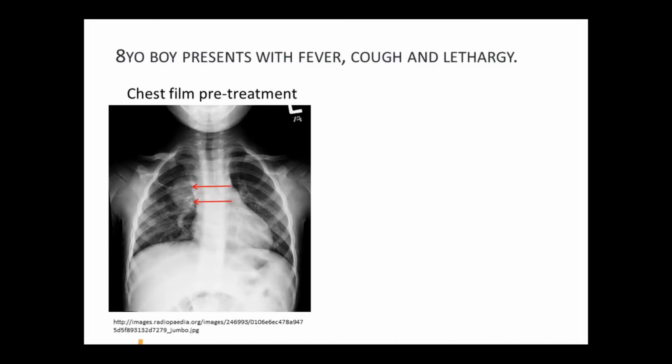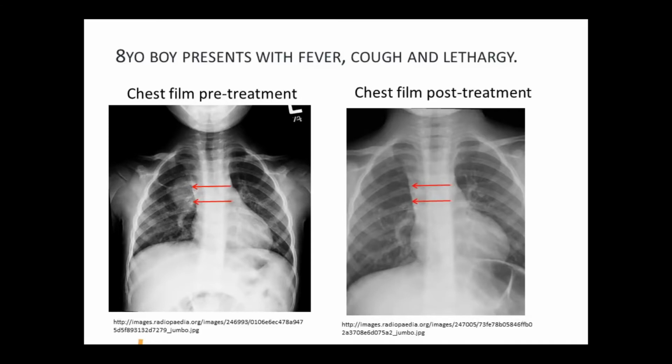Pneumococcal infection is the culprit in the majority of round pneumonia cases. The film on the right-hand side was taken after 10 days and shows resolution of the consolidation after empiric amoxicillin treatment.